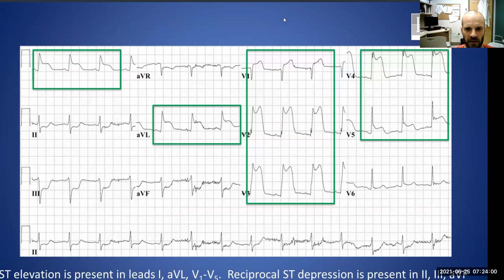So here's an example of an ECG where we've got these. I've highlighted them for you in green. You can see that although it's not present in all regions of the heart, in these that I've marked in green, the ST segments are quite clearly grossly elevated here. And here, wow, they're enormously elevated here, and here, and here, and here. Interestingly though, in some leads, it still looks pretty normal. And in some leads, you've actually got some ST depression instead.